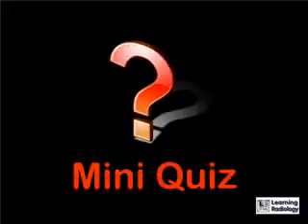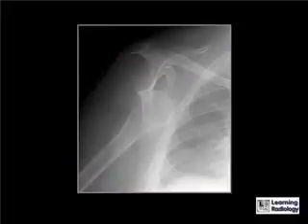Here is your mini quiz. You can pause your computer or MP3 player to decide what kind of shoulder dislocation this represents.